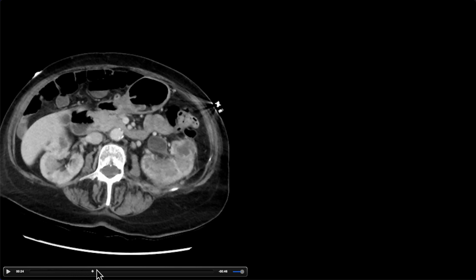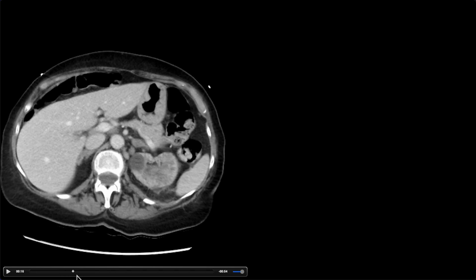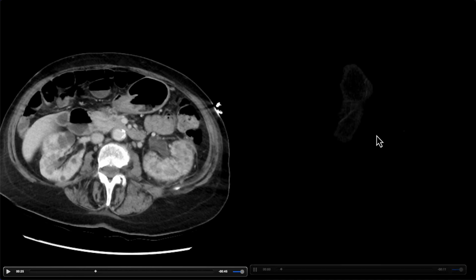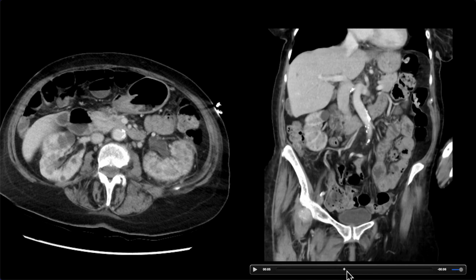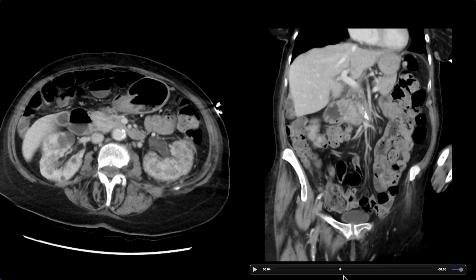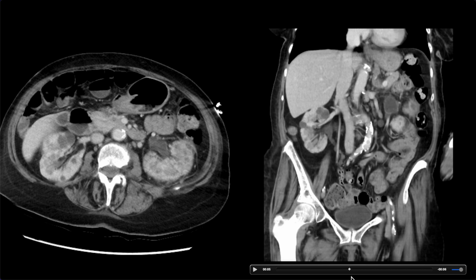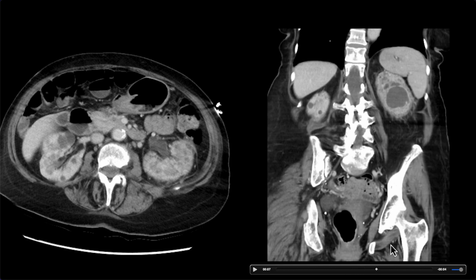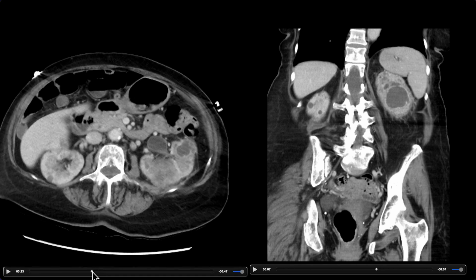All right, and so this patient is giving us yet another variation of cysts and abscesses. We have a background of microcystic renal disease related to the use of a medication. See if you can guess what that medication might be as I'm presenting here. We have a background of multiple, mostly small cysts, but also some 1 centimeter or so size cysts. But then there's this larger one here in the left interpolar kidney.